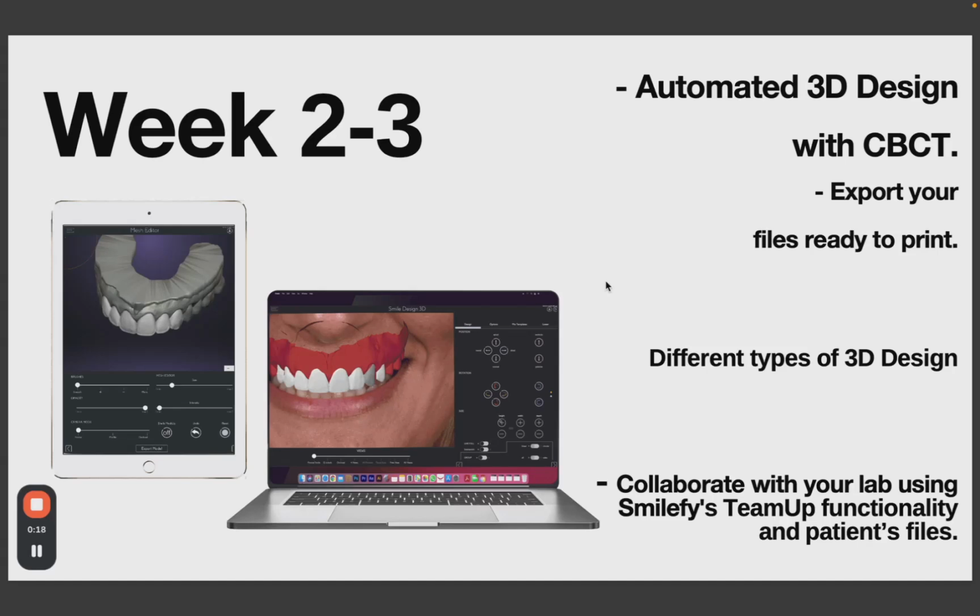In this training, you will be learning about the different types of 3D design that you can do in Smilefy. Smilefy offers a range of different types of 3D design, each serving a specific clinical purpose based on the stage of the treatment, patient's needs, and final outcome. Let's break it down and start with the Additive 3D shells mockup.